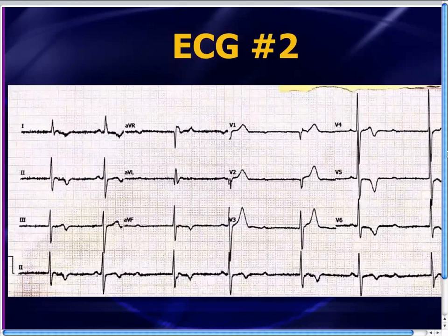Well, maybe not. Maybe so. I don't know. Mobitz 1, are the PRs getting longer? Mobitz 2, are the PRs staying constant? Let's take a look at the PR intervals. Well, there's a pretty normal looking PR right there. There's a really long PR, and then a P wave that's not conducted. Then the cycle starts over again. Pretty normal looking PR, a P wave that's pretty darn long, and then a P wave that's not conducted. And the cycle goes on the same way all the way across. So this is nothing more than simply a Mobitz 1 because the PRs are getting longer.